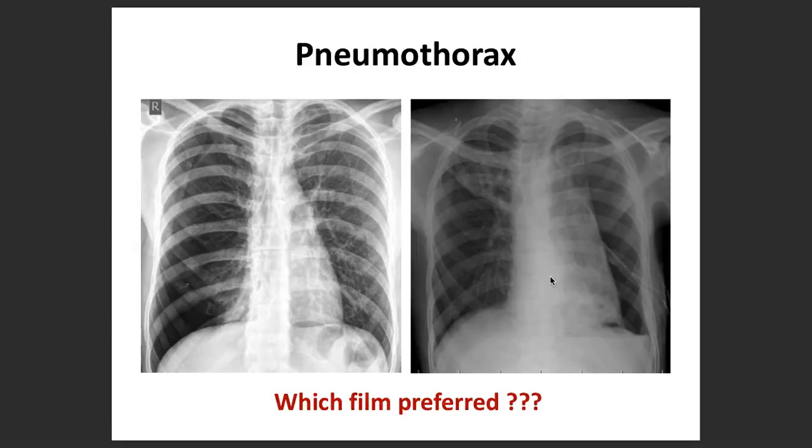If you are able to see the pleural line, run, run, run, emergency. You should try to immediately start arranging the things with which you are going to intervene. So a lot of times, a procedure has been done, an ablation procedure or cath procedure, and then the patient complains of shortness of breath and all. Then you get this X-ray. So this is the time for action.